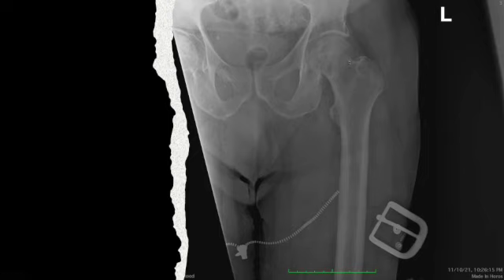When evaluating hip fractures, we can use Shenton's line, which is an imaginary line that courses along the medial aspect of the femoral neck to the inferior margin of the superior pubic ramus. We want to make sure that this line forms a nice circle, or otherwise we have suspicion that there's a possible impacted fracture or something wrong with the femoral neck.